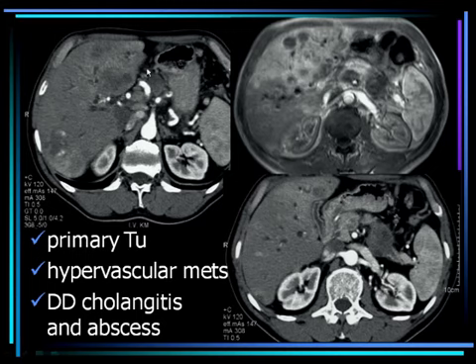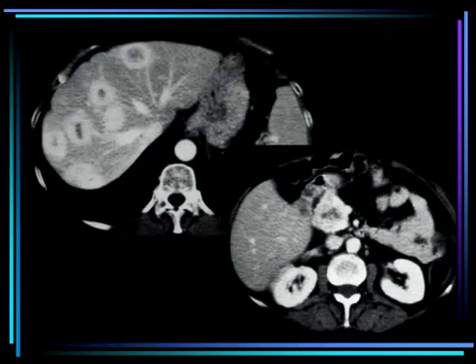No, they weren't. Is this lesion a metastasis? It's not a given that this is a metastasis. It could be an abscess. So be careful if you have dilatation of the intrahepatic bile ducts that you don't miss the metastasis, or that you don't say this patient is dead already. Multiple metastases. No, he's not dead, because the gastroenterologist says no, he has only fever. So be careful about that.